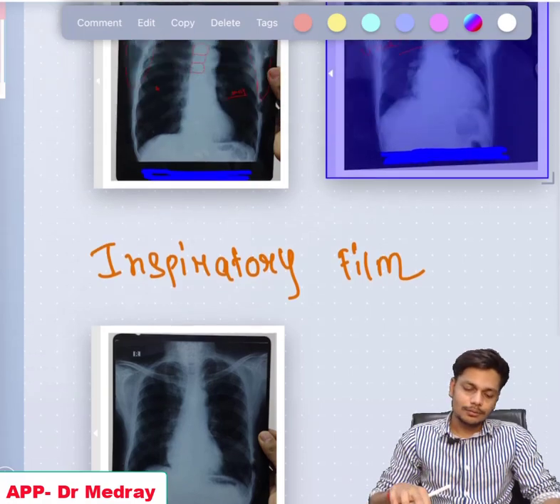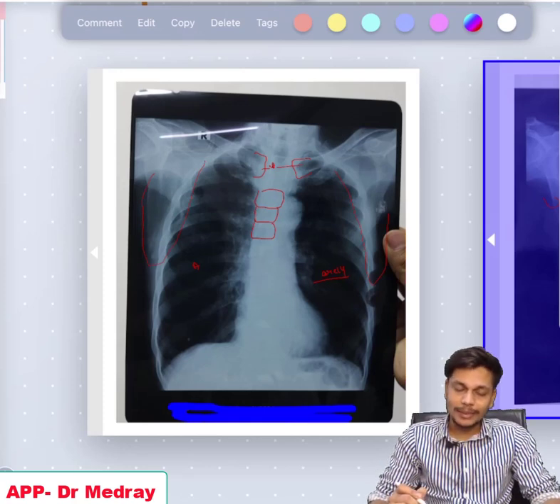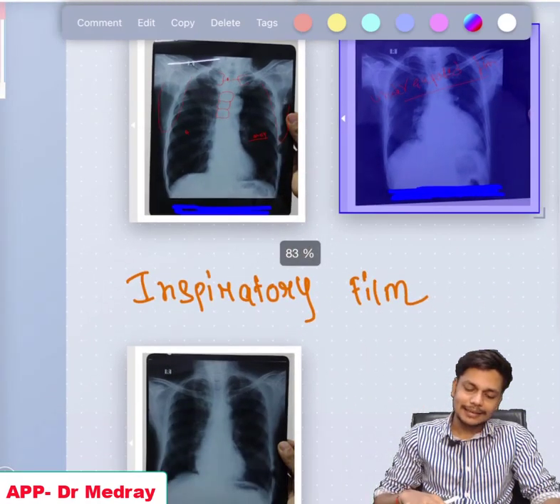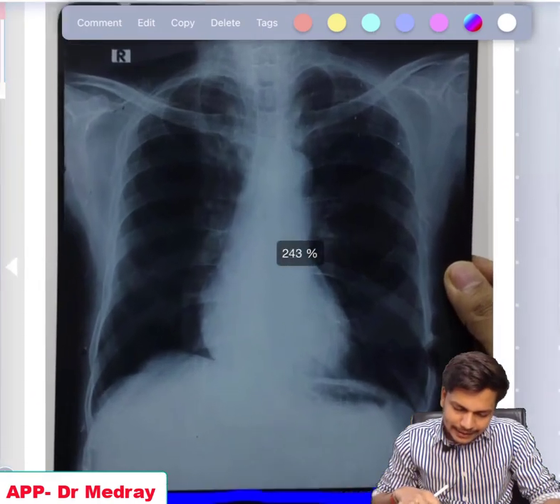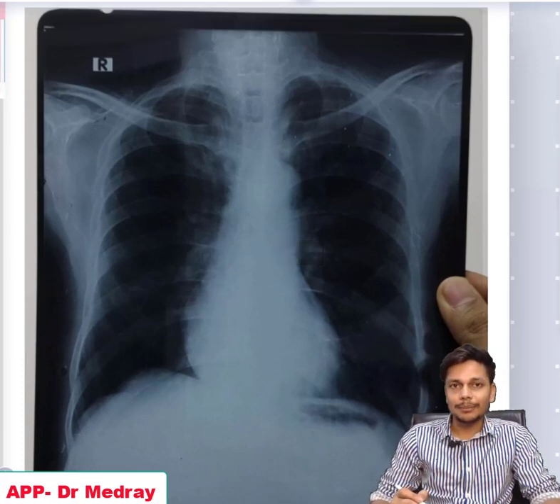So till now, how you will interpret the X-ray is that this is the skiagram showing the posterior anterior view. This skiagram is slightly a rotated film, and it is adequately exposed. Then you comment whether this is an inspiratory film or an expiratory film. How to know whether it is an inspiratory film or an expiratory film? For that you have to know about the ribs.